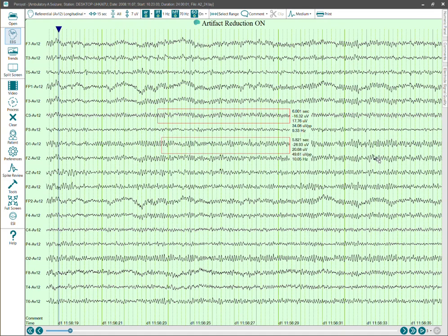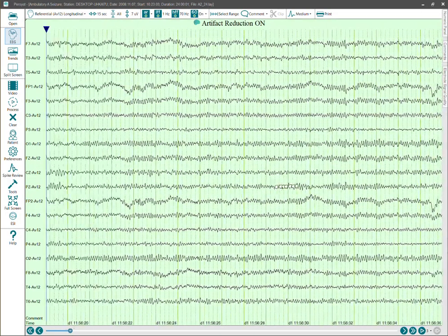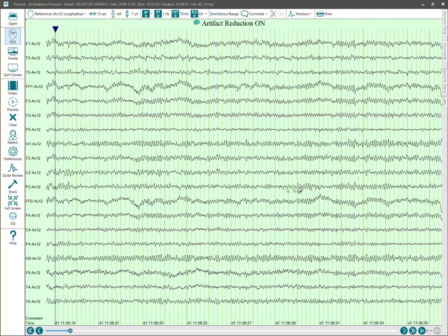Now, something to be aware of: if I click off of this, if I'm not using that quick stats tool, I can just click and hold and move the EEG this way. So if you go to click on the EEG and drag, well, you're dragging the EEG. If you want to measure it, use that quick stats. So that's the second way of measuring frequency.